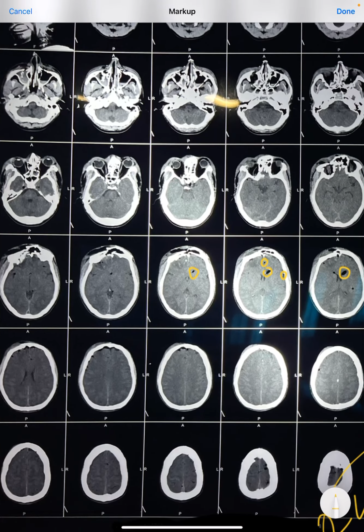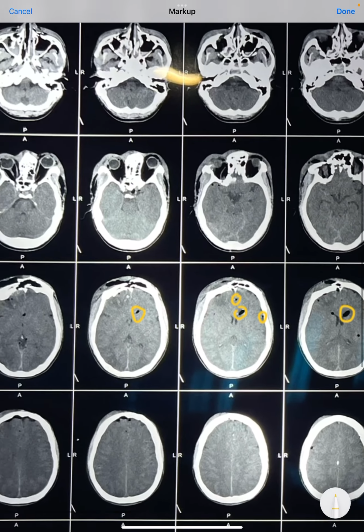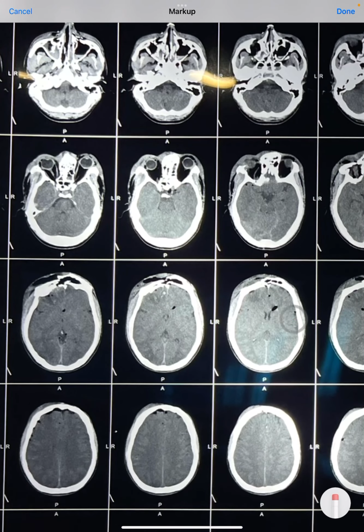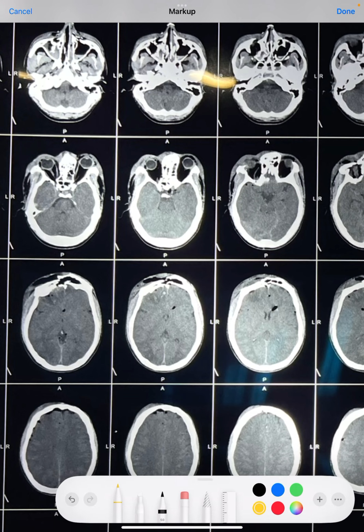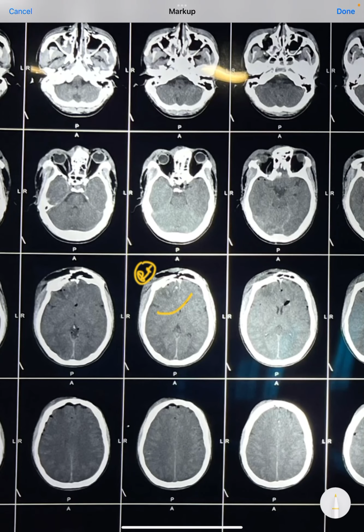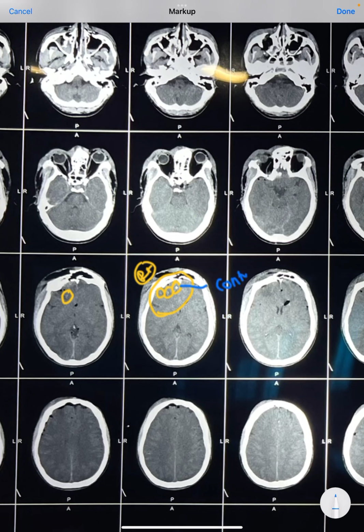But in this CT scan, there are some other findings which are very clear. Whenever there is a road traffic accident, we always get contusional bleeding or traumatic bleeding. We know that this patient had a right-sided injury, and when we zoom in, we can see in here this dense white structure is blood. This is contusional bleeding. Here also you can see the dense white density is blood. So these are all bleeding because of the contusional injury. These are contusional bleeds which appear very hyperdense.